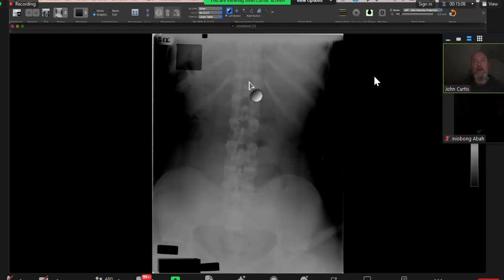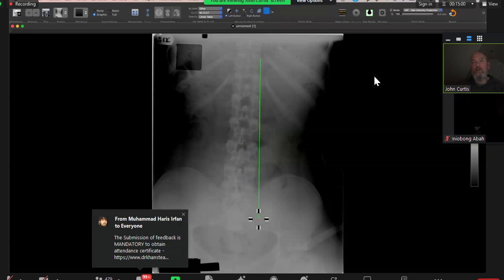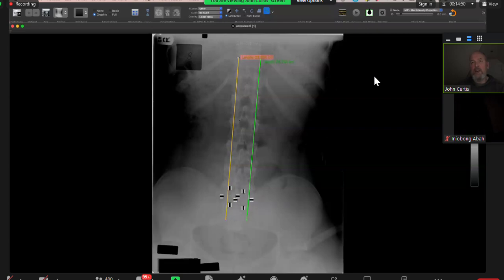And achondroplasia. So the interpedicular distance should get bigger. So it should go out like that, but it doesn't. It goes in like that. And there's the interpedicular distance there. So these lines should actually diverge. Yeah. So that's one of the features that you see.